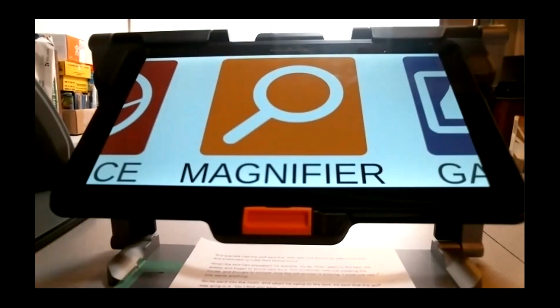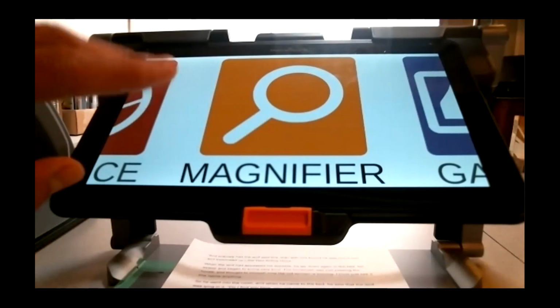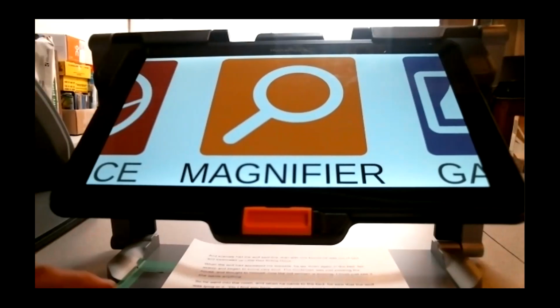I'll be showing you where to use all these gestures. And also the gestures from the swipe from up top to bottom, bottom to top, that can be also used. Those are maybe more advanced gestures, which I'll be showing you a couple of ways of using. And also two finger double tap. So you have two fingers and you do a double tap, or two finger tap will also do other things.